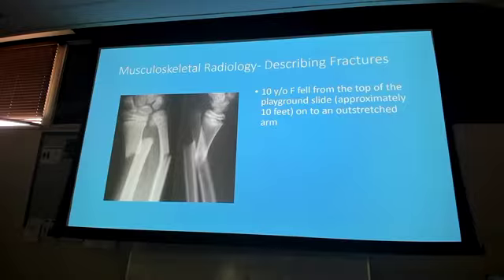And then if you look closely, it almost looks like that epiphysis is in maybe more than one piece. Right, I've got this radiolucent line underneath here, possibly that fracture too, so I'd be okay with comminuted. I'd be okay with the incomplete greenstick with the Salter-Harris 1, right? This is just going to show you that there can be multiple abnormalities on one x-ray. Just try to paint the picture as best you can.